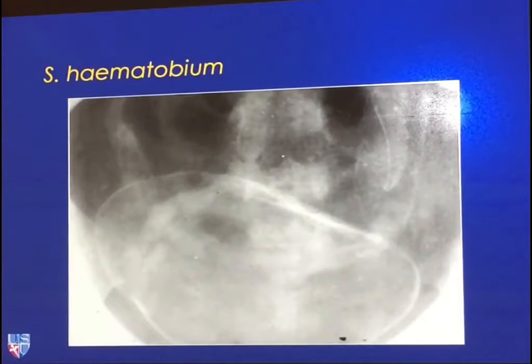Now finally, here is a classic radiology one. Here is a cone-down radiograph of the pelvis. You can see this oval structure here. They've had no contrast or anything, just a plain old X-ray, and the periphery of the bladder is diffusely calcified, so you can see it very well. And then you can notice here, these are the ureters, which are also calcified.